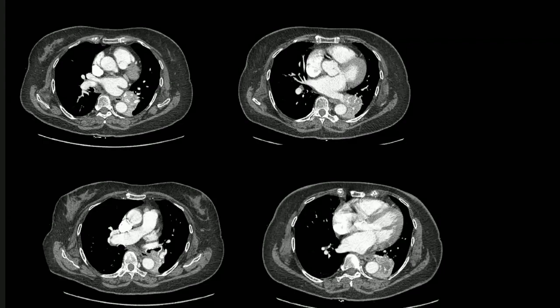So number one, the bones are okay. Dr. Kushberg, when you say that this lesion is surrounding the descending thoracic aorta, are you changing the location of the lesion? What do you think? When we say in a report that the lesion is surrounding the descending thoracic aorta, doesn't it imply that it's in the posterior mediastinum?